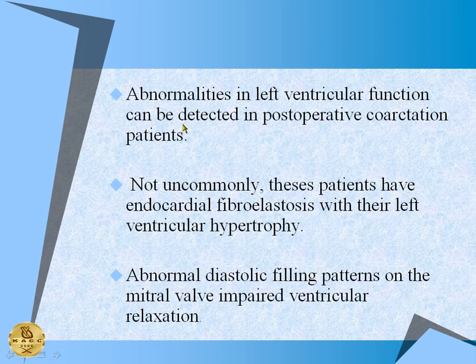Abnormalities in the left ventricular function can be detected in the postoperative coarctation patient. So with coarctation, you don't just go for the 2D or that segment of the aorta. Coarctation has effects on the function of the left ventricle, and that's important. So we can assess those, especially in the postoperative patient.